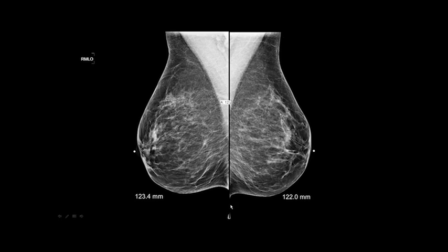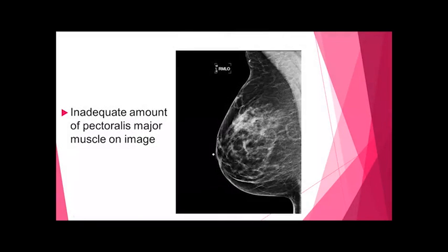Plus the IMF isn't on there clearly. It might be on there, but it's darkened out from the post-processing and the KVP. So I would not have sent these in. And I would not recommend that.